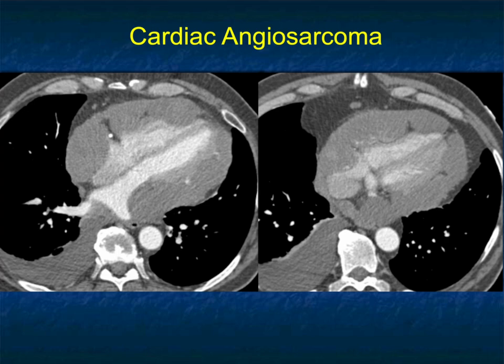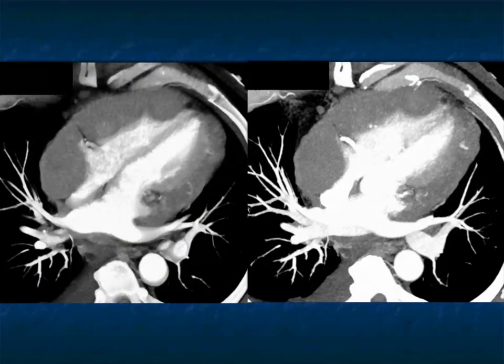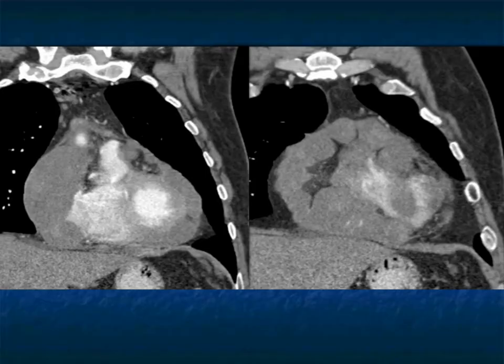When I see a lot of pericardial involvement, I'm surely thinking about lymphoma. There aren't that many primary sarcomas of the pericardium, but angiosarcoma, again, extension in and involvement is probably the best bet in this case. And here's just a few more images, very nicely shown with MIP imaging. And again, giving you that look on the coronal display. There's adenopathy present as well, but how extensive this patient's tumor is.